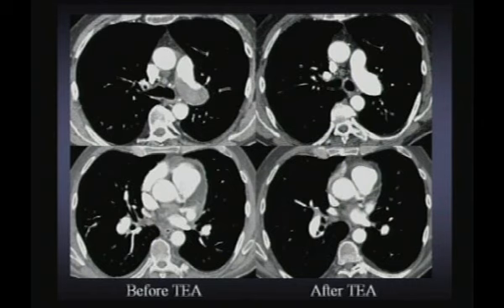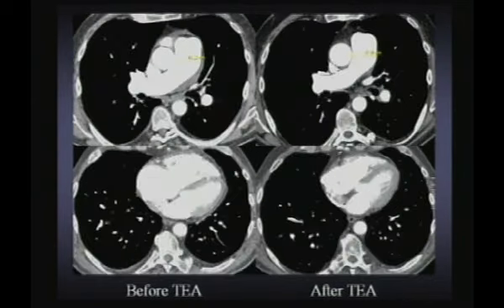This is a patient who I've demonstrated to you earlier on already, who had features of chronic thromboembolic disease originally and underwent a pulmonary thromboendarterectomy. You can see that the pulmonary artery is still enlarged, but all the clot that was previously identified has left. We can see that the webs and the strictures that were present before are also resolved, and an almost normal appearance of these pulmonary arteries now. The main pulmonary artery has reduced in size, and the features of right cardiac dilatation have also significantly improved.